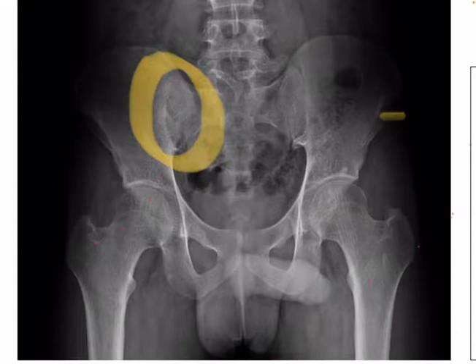Okay, when the patient tries to stop himself or herself, the pain will increase, and there will be night sweating, and there will be some other complications if it is TB of the joint. So why do we see this unilateral? What will you guess? We can say that maybe it is not a hematogenous spread of the TB, and since it is unilateral, it may be some sort of direct invasion, which is very rare, or it may be lymphogenous spread of the mycobacterium tuberculosis to that particular joint on this side.